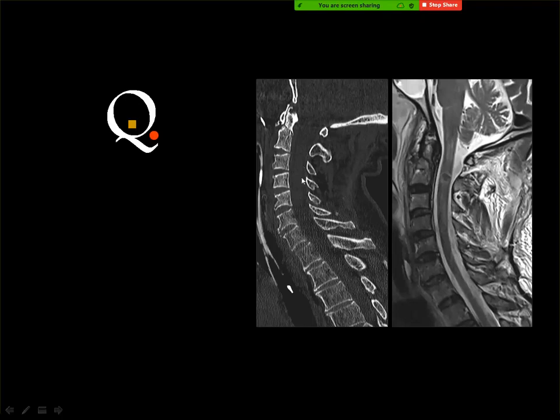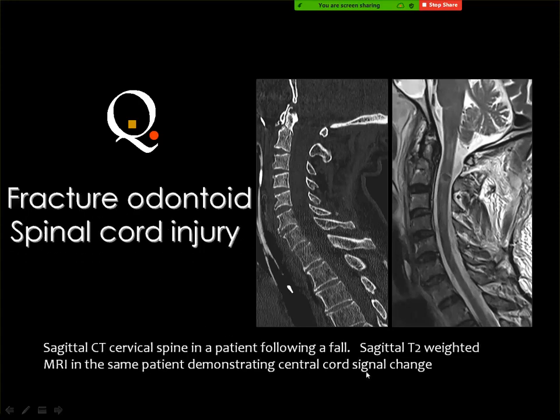This region is frequently missed during the evaluation of the spine because we usually concentrate on the disc bulge, herniation and the intramedullary abnormalities. Also, this area is missed because it is not included in the axial images. The final answer here is a fracture of the odontoid process and intramedullary acute hematoma.